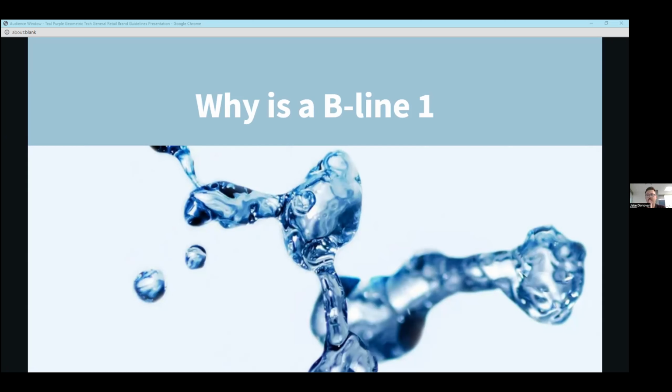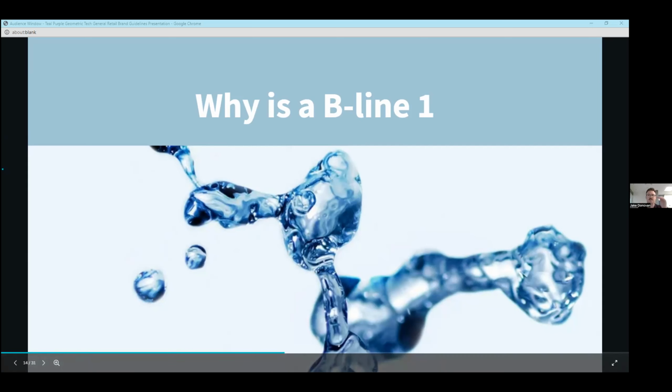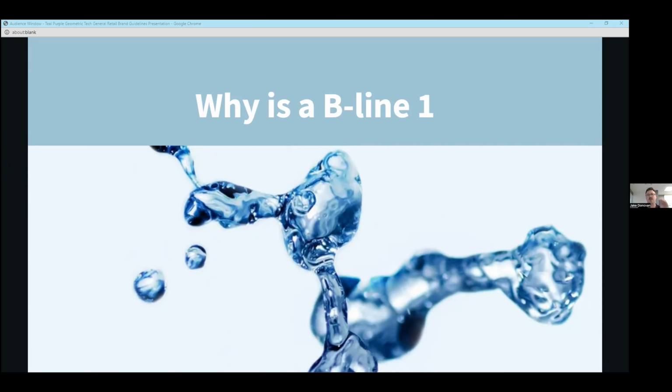So if you think about your unbroken line of air in the lung, and then this tiny little interlobular septa swells because there's too much fluid in it, that allows a window for the sound to get in. But because it's interacting with these air-water interfaces within or around the alveoli, it bounces back and forth at high speed and causes this reverberation artifact, which is the B line. So that's theory explanation number one.